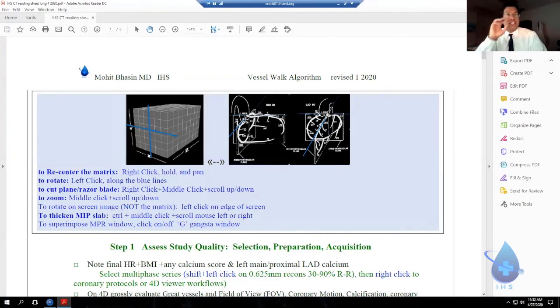This is a little bit like when you have an echo probe in your hand and you put it on the PMI and you got to do your own echo. You know how you have to rotate that probe 30 degrees, 90 degrees to get the right views. You're doing the same thing to get standard cardiac plane views, only you're not doing it with your hand on an echo probe. Here you're doing it on the workstation, moving along the blue lines on the Terra Recon, okay?